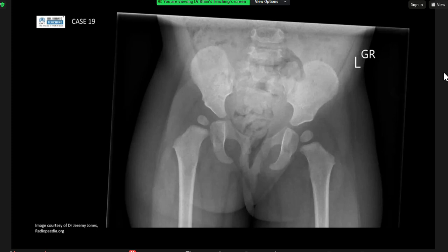for hip dislocation. As I can see at the right side, there is mild disruption of the Shenton line, and the femoral head epiphysis is slightly smaller, asymmetrical. I want to see the Hilgenreiner line, and if the femoral head is within the medial two-thirds, and if there is soft tissue swelling or elevation. The pelvic X-ray is a bit tilted, not well centralized. However, I will raise the suspicion of right-sided DDH. Yep, well done. Yep, correct.